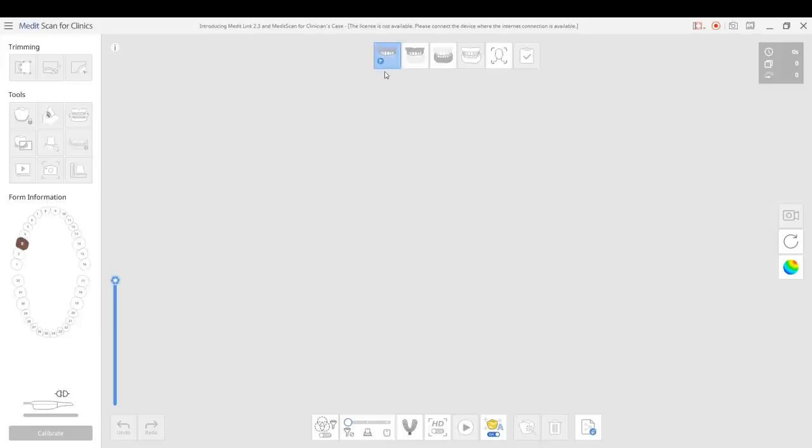Whatever you scan in the pre-op scan will be copied over to the jaw scan, and we'll show you how to use this where you can copy a pre-existing tooth or a crown that you love the shape of, or you have a denture that retrofits to that. You can scan the pre-op of that, scan the prep, and the lab or yourself can manufacture a copy of that pre-op condition and render a restoration that perfectly replicates what was there before.